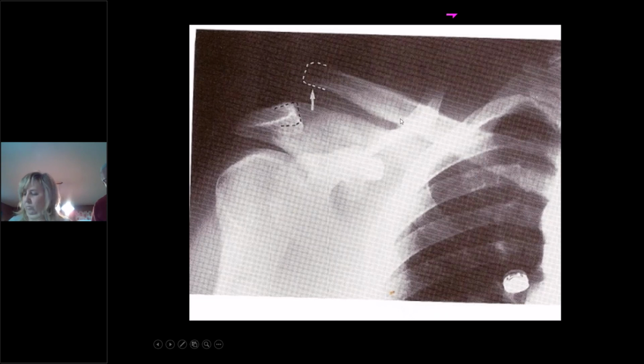Typically when we're looking at this, we see the clavicle, we see the acromion, and then there's a complete disruption of that acromioclavicular ligament, which allows this guy to ride up. You'll definitely see a deformity on the skin. The question then is, hey, is this fractured, or is it an AC disruption or separation? And that's where the x-ray comes into play. Obviously, this is a picture of an AC disruption, or acromioclavicular separation. So that's what it would look like.